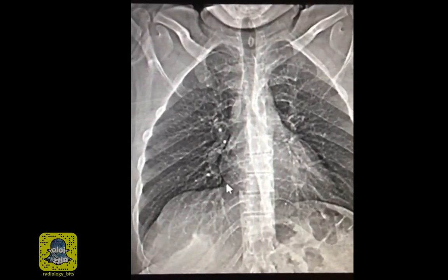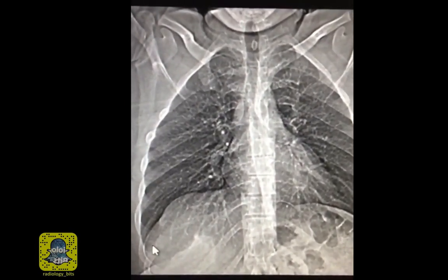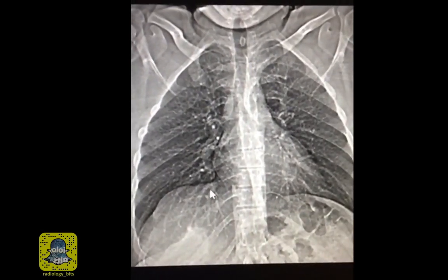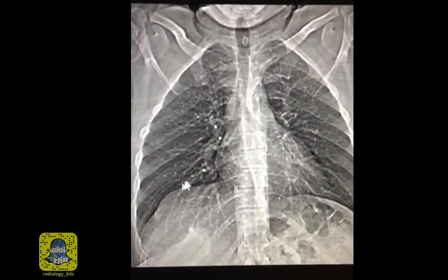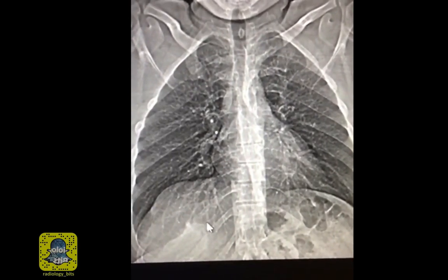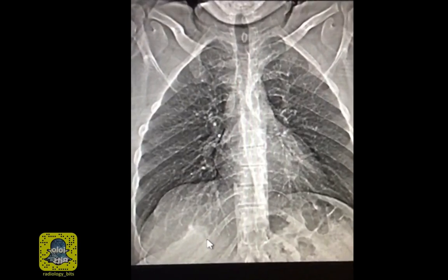In fact, the lungs descend deeply within the costophrenic sulcus and wrap around the hemidiaphragm. That's why you could see lung markings through the diaphragmatic and hepatic opacity here. So don't be surprised if you see a lung abnormality such as consolidation or metastasis through the hemidiaphragm.